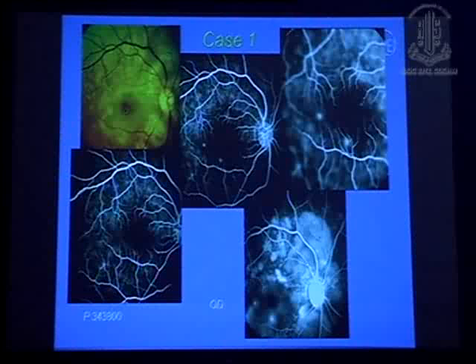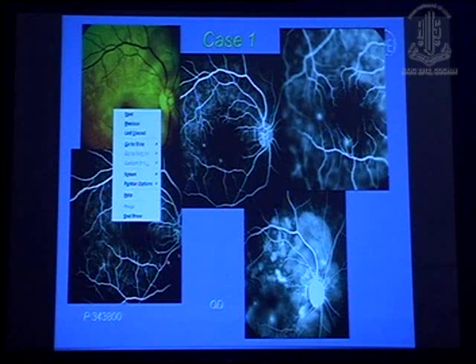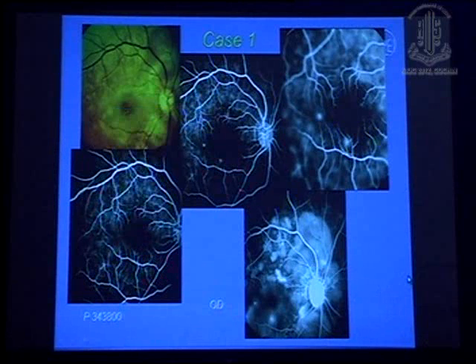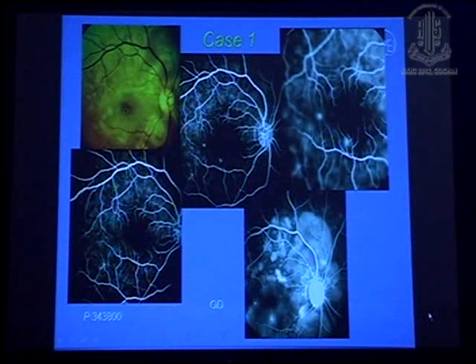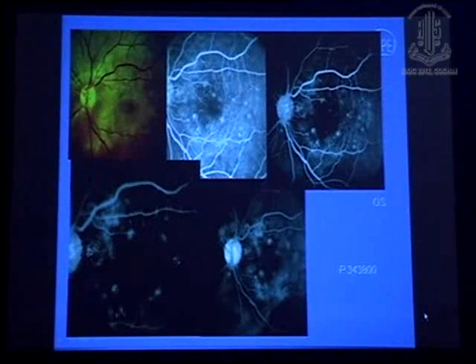And the fluorescein angiogram shows some hyperfluorescence. There are different phases. This is the earliest phase of all the phases, which are increasing in size, and maybe some white dot syndrome. Some form. You see, white dot syndrome is diagnosed on color photography. So what does FA show? Multiple areas of hyperfluorescence, if this is the picture for the left eye.